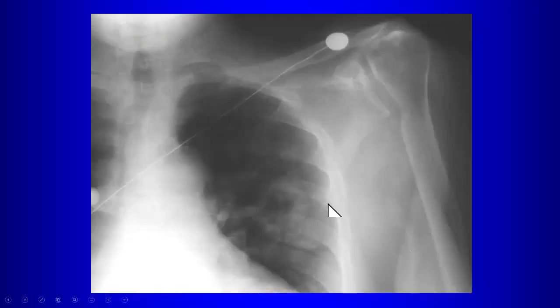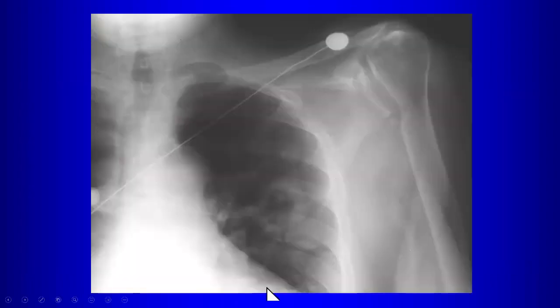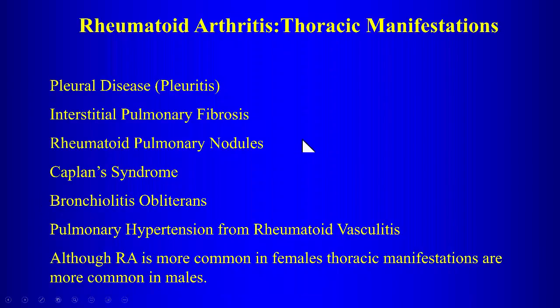So in that type of patient who has cavitary nodules, it's a pretty rare diagnosis, but you might consider rheumatoid nodules. These can be associated with cavitation. Usually the rheumatoid arthritis is long established and advanced, so it's not usually the first time you're considering rheumatoid arthritis in the patient. But the rheumatoid changes in the shoulder should give you a clue as to what you might include on your differential diagnosis.